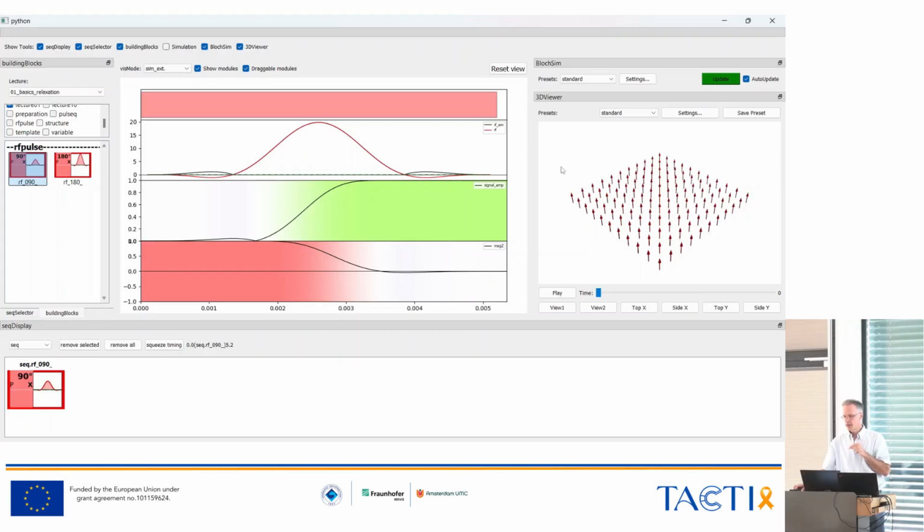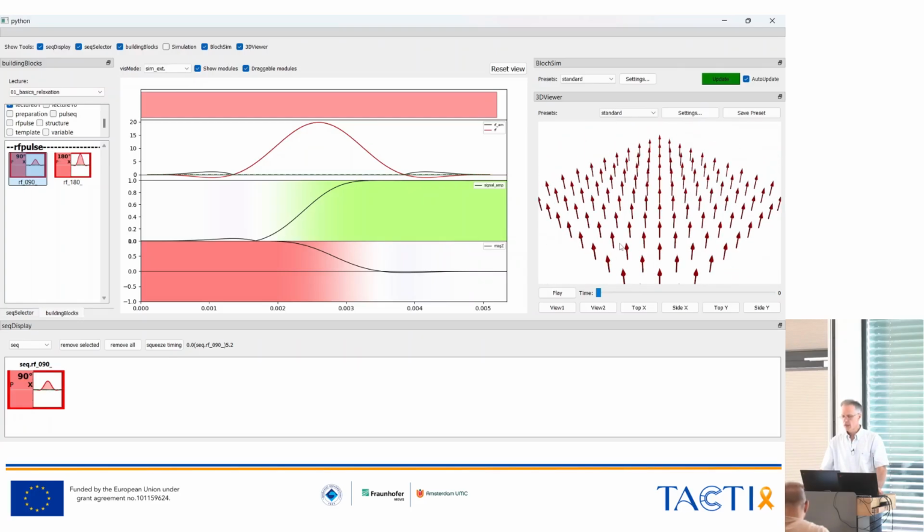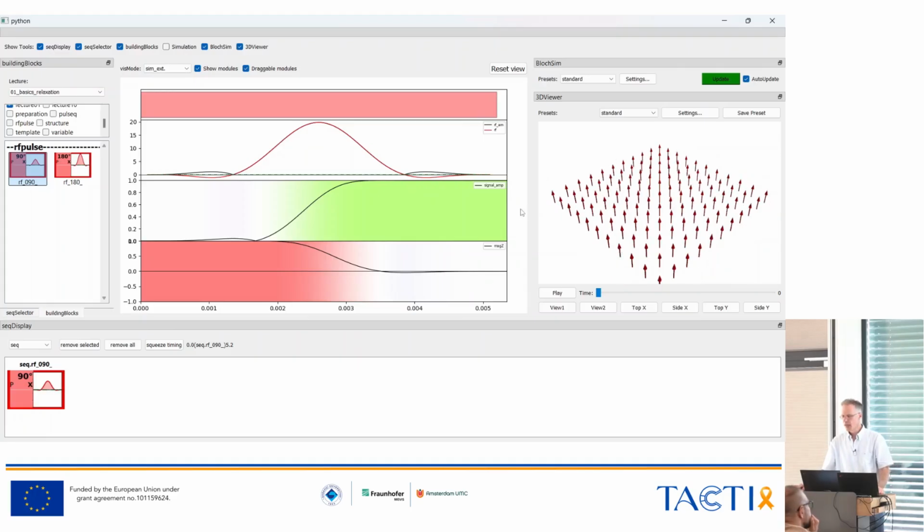And if you look at the far right side, we are already seeing some arrows here. Those arrows just mark the magnetization at this exact location. So relatively simply, we have 11 by 11 magnetization spins. And for each of those magnetizations, we have one line in this additional plot here, which is shown by different colors.